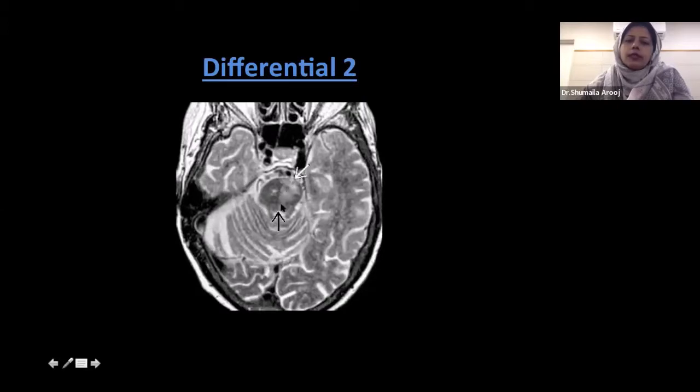This was another patient, and this patient also had some abnormal signals in the pons, but you can appreciate that there is a well demarcated line dividing the pons into right and left halves, and the left hemi pons has a geometric kind of distribution with some hyperintense signals in this region. This geometric demarcation favors a vascular cause, that this side is supplied by left-sided pontine vessels. So this was basically a case of pontine infarct.